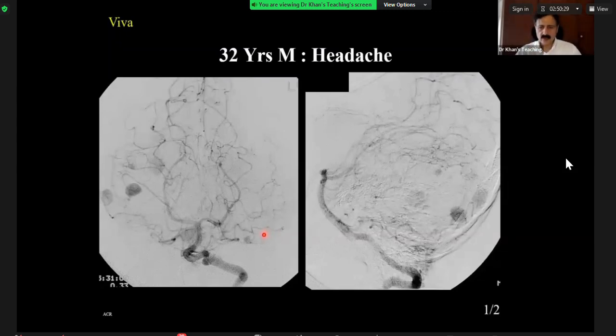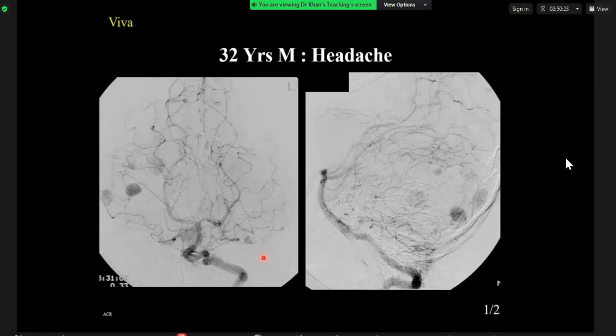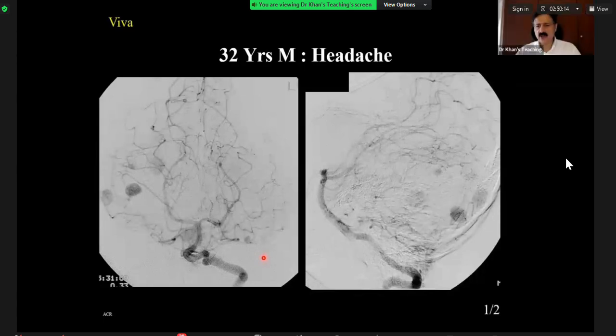Candidate 2, over to you. Can you name the procedure? Yeah, this is a selective intracranial digital subtraction angiography. Which kind of angiography is it, and what are the findings?